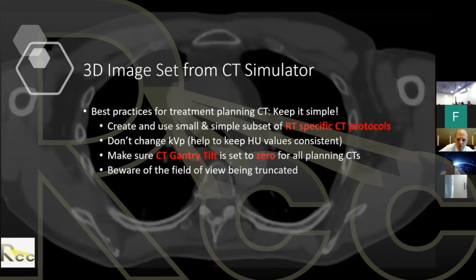Yes, and Ben is stressing the point that when you draw your contours, you ultimately draw them on your primary image, which is your planning CT, correct? And it's not one slice, it's multiple slices, correct? That's right. It should be associated with the planning CT. But you can still use other image sets to inform where those contours are in that contouring process. In the end, it'll be associated with the planning CT.